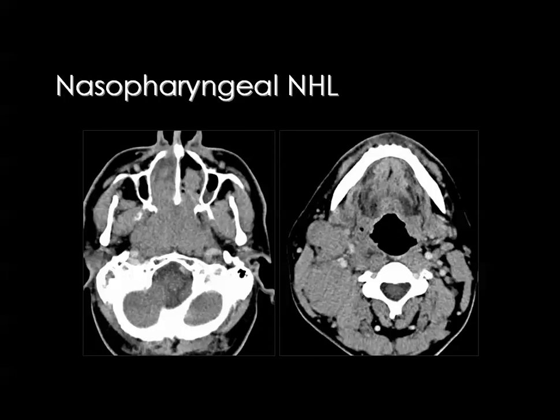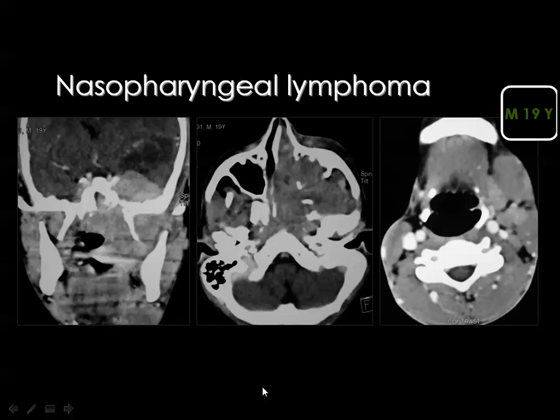You know, metastatic lymphadenopathy from carcinomas is usually necrotic and contains areas of central breakdown. Then you see the creeping nature of the mass, the bilaterality of the lesion, and the homogeneous density and enhancement, and this was a nasopharyngeal non-Hodgkin lymphoma.